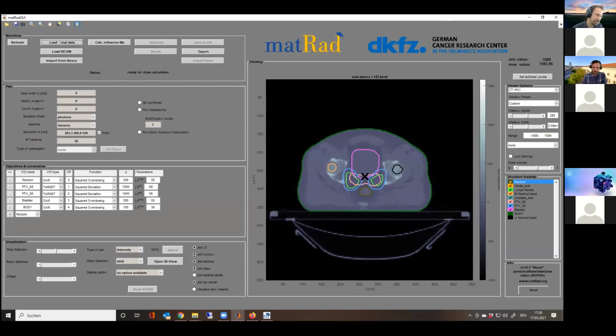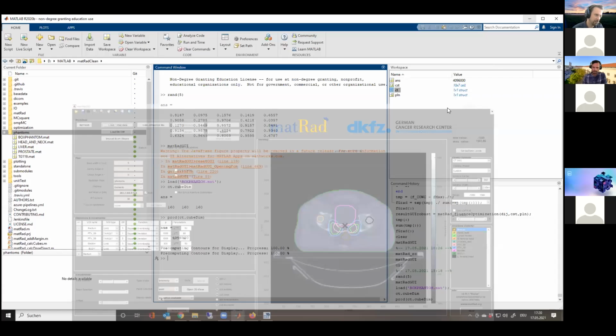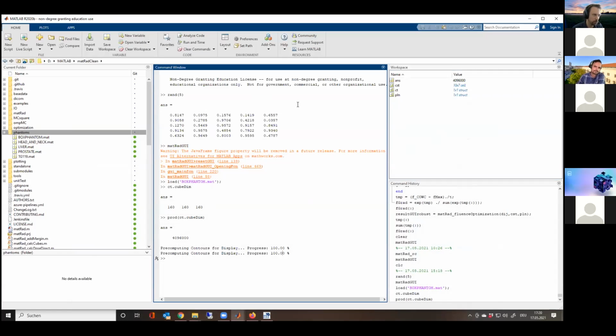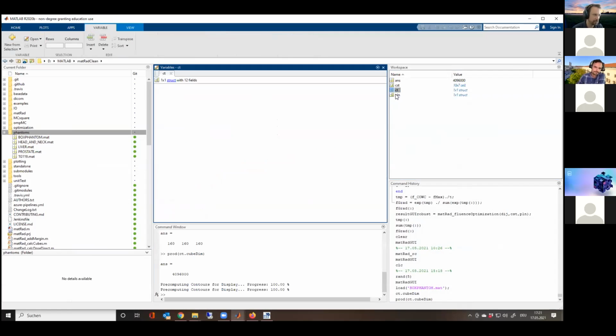But at the same time, you can go back to the scripting window, the command window and the variables, and now you will see you have a different cube here. It has a little bit more information, some DICOM information because the original files were DICOM, but that's now the prostate cube lying there. So that's how we will use both of these functionalities, user interface and commands.